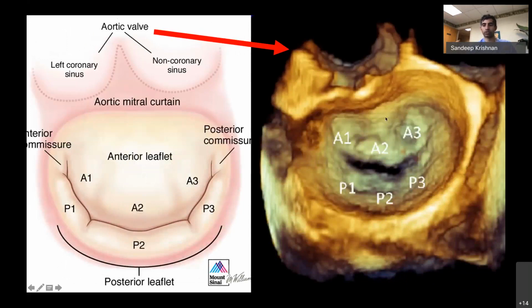Same thing here. This is what we call the surgeon's view, and this is a 3D TEE image. So for those of you who are not doing TEE routinely, this is the lateral side. So remember 1 is the L. So that's the L over here on the left. And then 3 here is medial, and that's on the right. So maybe you can even see the left atrial appendage on this side. The left upper pulmonary vein is on that side as well.